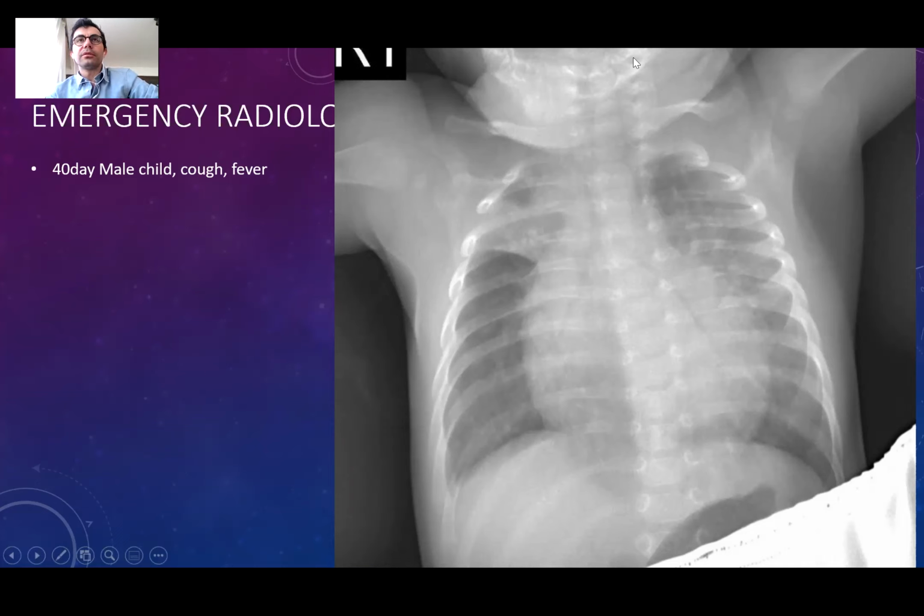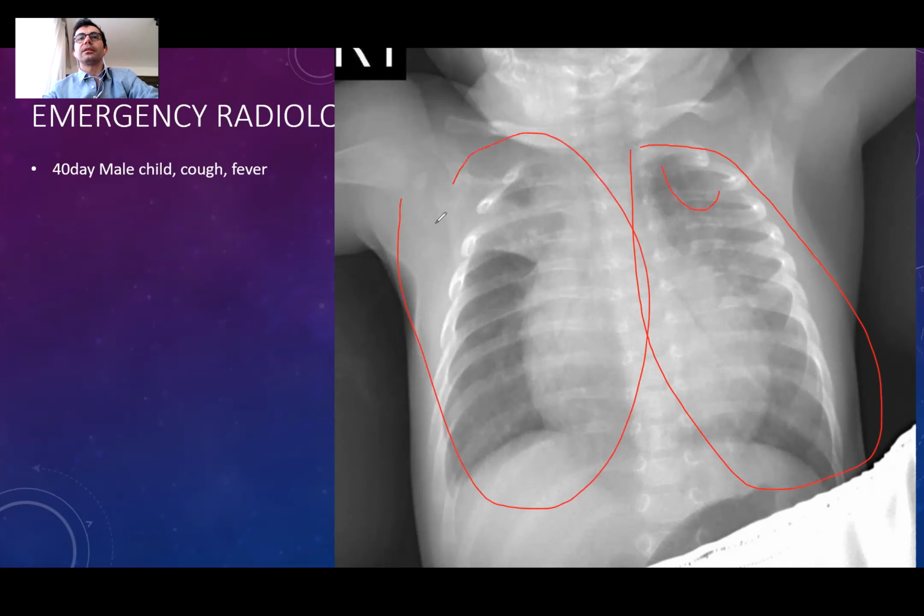Okay, very good. By the way, if you take your mouse to the very top of the screen, you can add annotations, and everybody can write. If you are trying to point to an area, you can do it with Zoom. So the patient's left lung is actually brighter than the right lung, right? Generally, this area is much brighter than this area. This is very good, doctor. Very good that you talk about this.